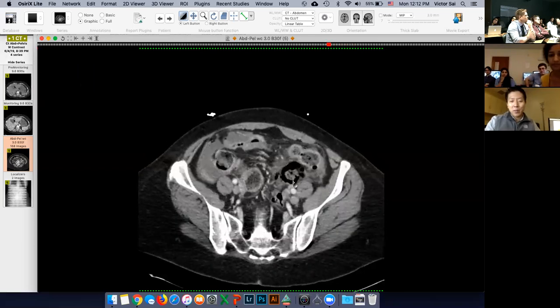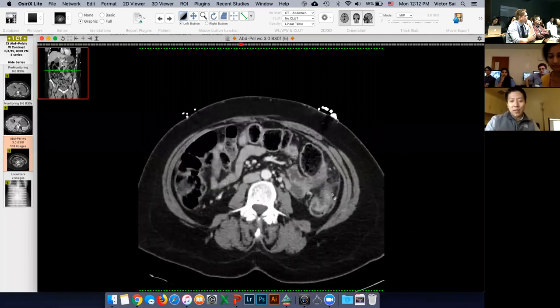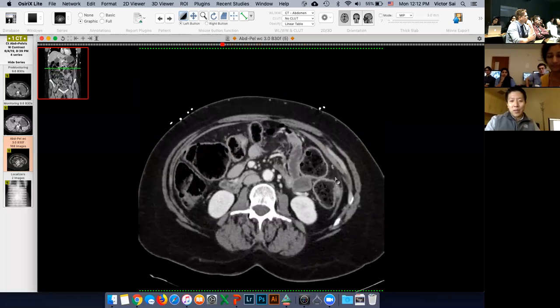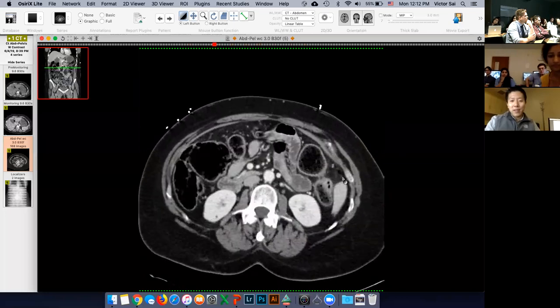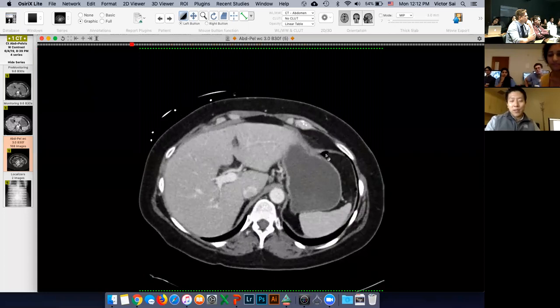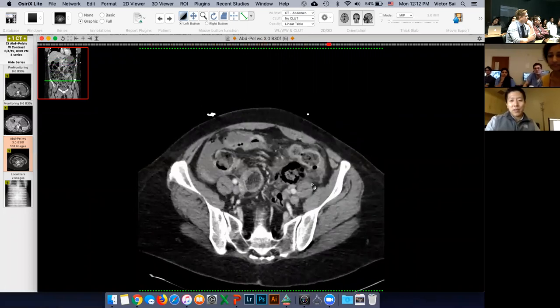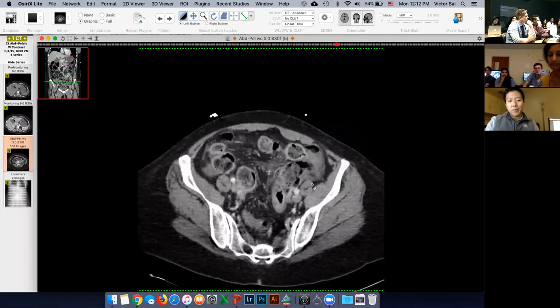And also, this is not only an extraluminal collection. When they're reading this case, they should not have missed these foci there, which are harder for us to see quickly during a case conference. But this person clearly had a perforation.